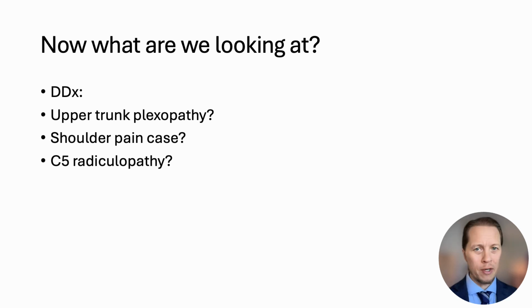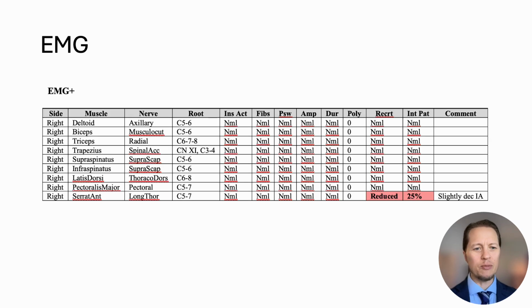There is one that is not listed that you're probably waiting for, and well, guess what? It's coming up right now. Left that one out on purpose. So let's move on to the EMG.